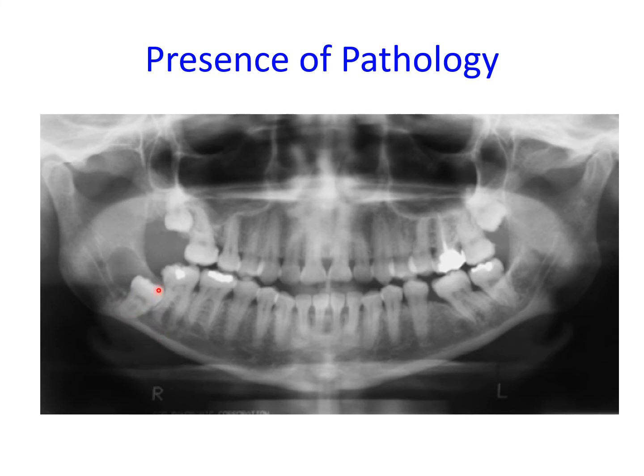And you can also see that due to the presence of the cystic lesion, the mandibular third molar is displaced close to the lower border of the mandible, and there may be a risk of fracture of the mandible during removal of the third molar. So you might want to marsupialize this cystic lesion to allow some bone healing, followed by removal of the mandibular third molar and enucleation of the cyst as a secondary procedure.